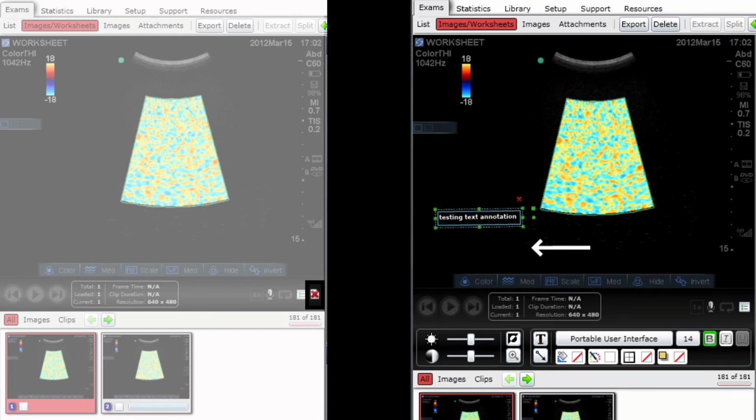If you have annotations on the image and you need to hide them, you can click on the red X that will hide the annotations. You can click it again to make them reappear, in case there is text or arrows covering part of the image and you want to see what's behind them. We may use the annotations to point out specific findings as part of your QA review, and it will be noted in the feedback document to refer to annotated images.